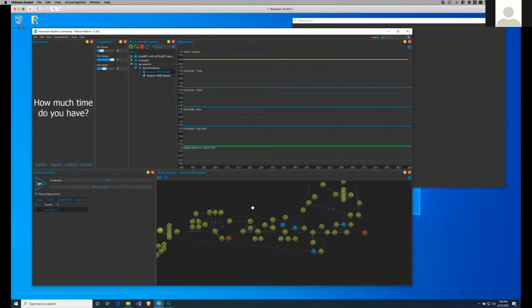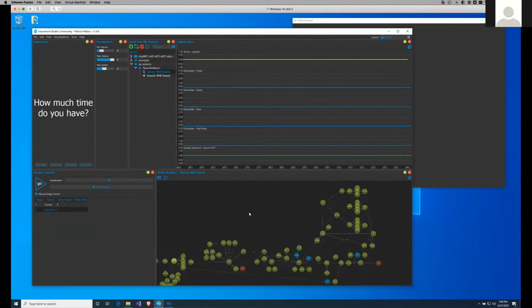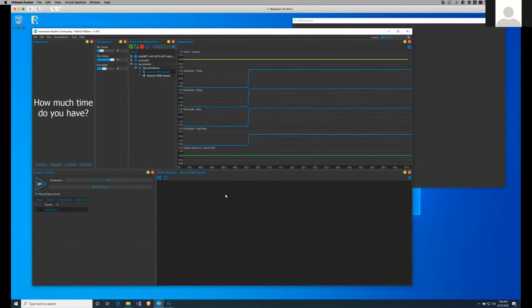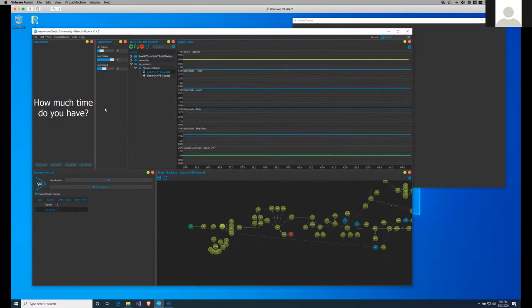And there's also a little trick, by the way, for you guys. If for whatever reason the state machine looks black, that just means that the focus is not right in the middle, and you can focus right into the state machine, or the classifier, by pressing the A key on your keyboard. And then it's back. It's easy to be somewhere out, and then wonder where the state machine is. Just press A and it will be back.